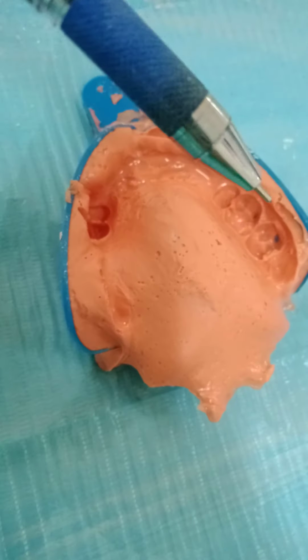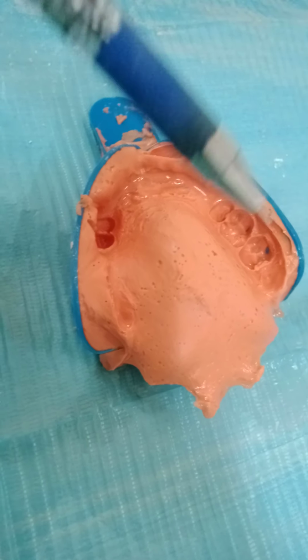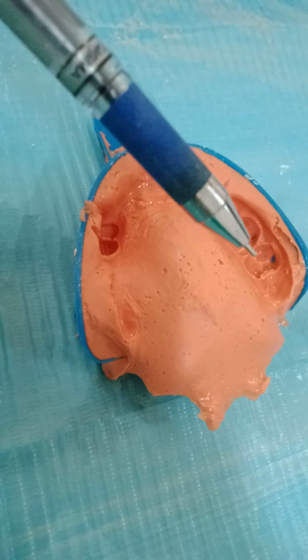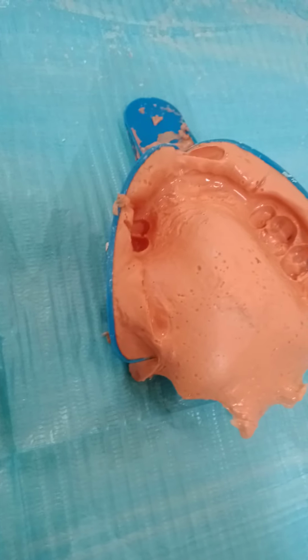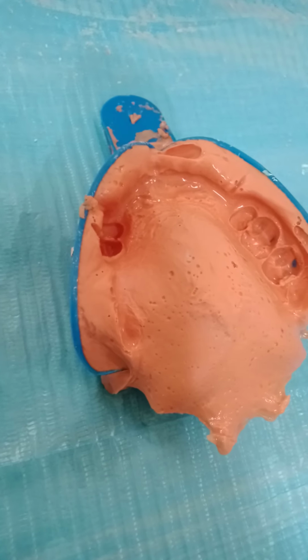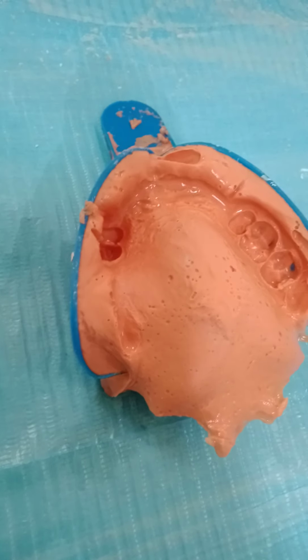Do you think with this drag that happened, because once the tooth touches the tray, it will drag the material away. So the buccal surface is not captured correctly. Can I place a clasp over it? I will not know where the marginal gingiva correctly is. The material is not accurate buccally. So I need to take a secondary impression.